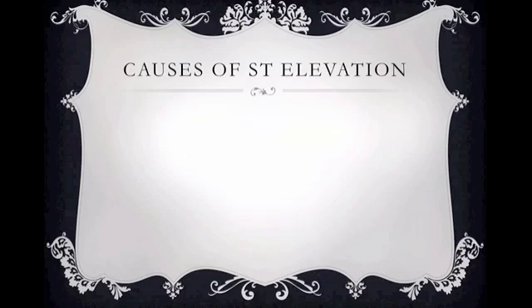ST segment elevation. Well, there are many different causes of ST segment elevation. The best mnemonic that I could find, which I didn't think of, is ELEVATION itself. We're going to start with E for electrolytes, and that's when we're mainly talking about potassium, hyperkalemia. L, left bundle branch block. Early repol, our second E.